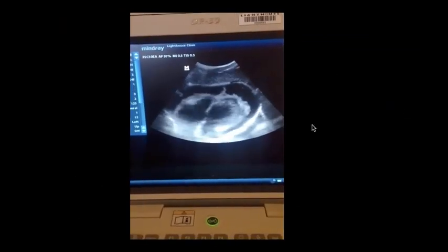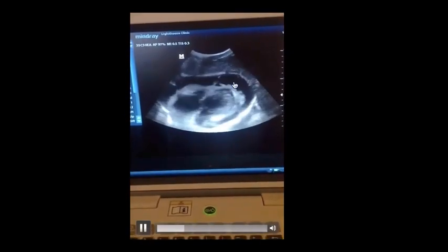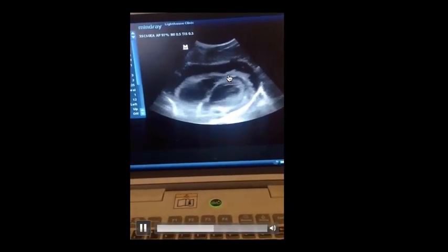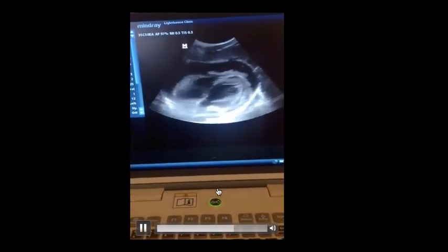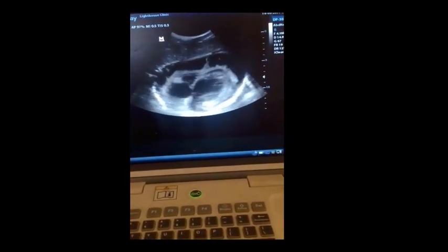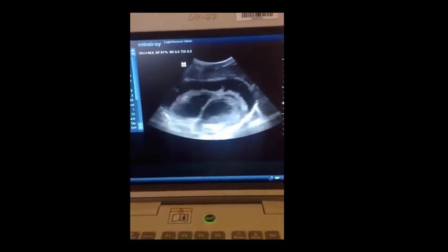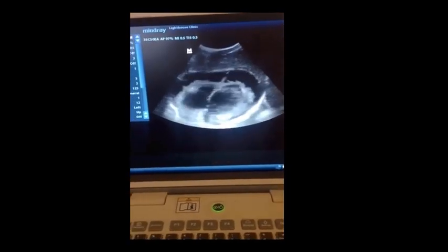The next clip shows you basically the same. Again, you see these fibrin strands and fibrin septa here. But what it additionally shows you is, this is a clip that was sent to me via WhatsApp. So it shows you that if you are not sure what you're seeing, or if you want second advice from a colleague, WhatsApp, film the screen, and WhatsApp is quite a good way to get quick advice from somebody who is more experienced.